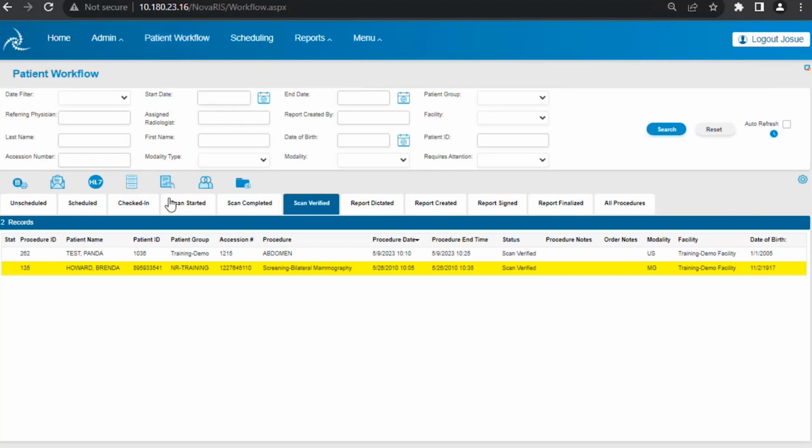Some of those additional ones, you can see between schedule and check-in, you have two optional statuses, the screen and the arrived. The main objective for the screen one is for those patients that will require special attention for complicated procedures. The best example I can give you is nuclear medicine studies, those with and without contrast and the type of contrast that you have to give to your patients. It will take not just preparation when they are at home, but also when they are on site. So in this case, most likely you will want to have that screen additional status, and you will move only those patients that require it to that screen list.